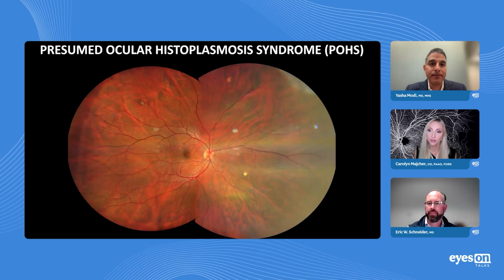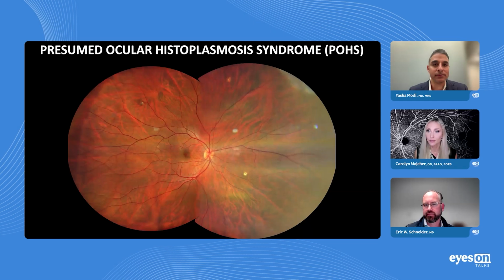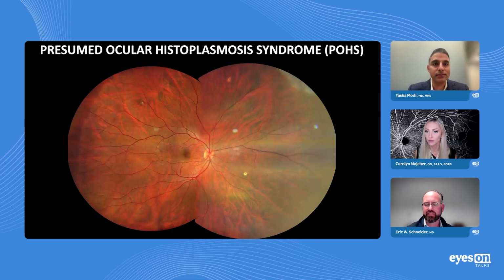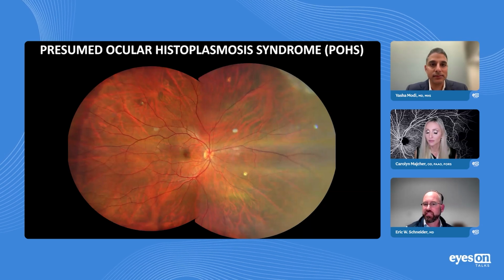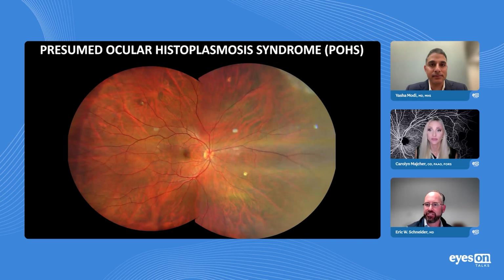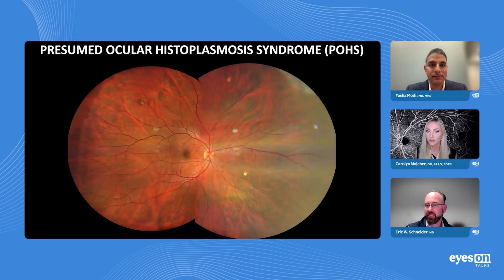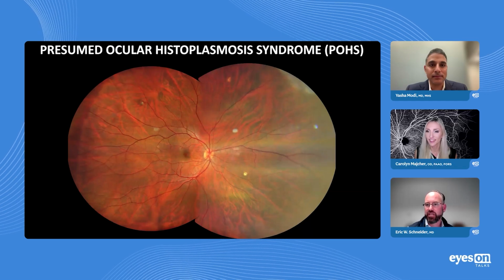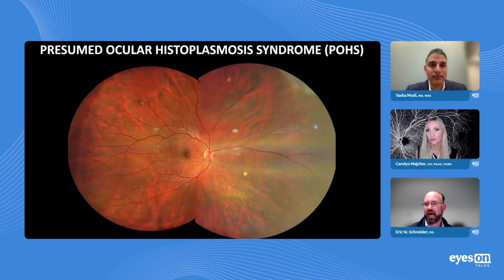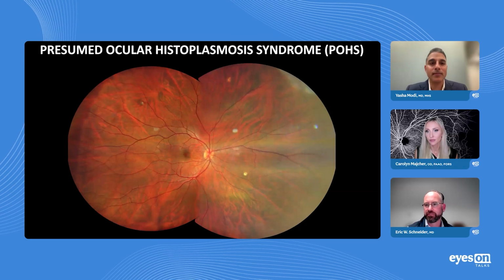I think structural OCT is still very helpful. As Carolyn showed, you can see this ill-defined hyperreflective lesion in the subretinal space, but these can be quite small. It's interesting that a lot of these patients can be incredibly symptomatic with tiny lesions, right? Patients will come in and say, there's this horrible thing in my vision, and I look on structural OCT, and it can be challenging to see that, although it can be picked up with careful analysis. But I think OCTA really highlights that. It really pops on OCTA. So I prefer to use both modalities in conjunction.